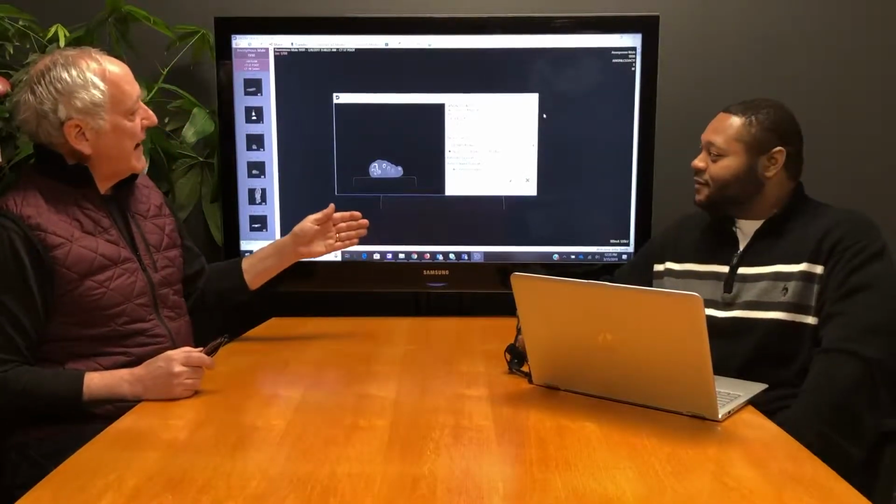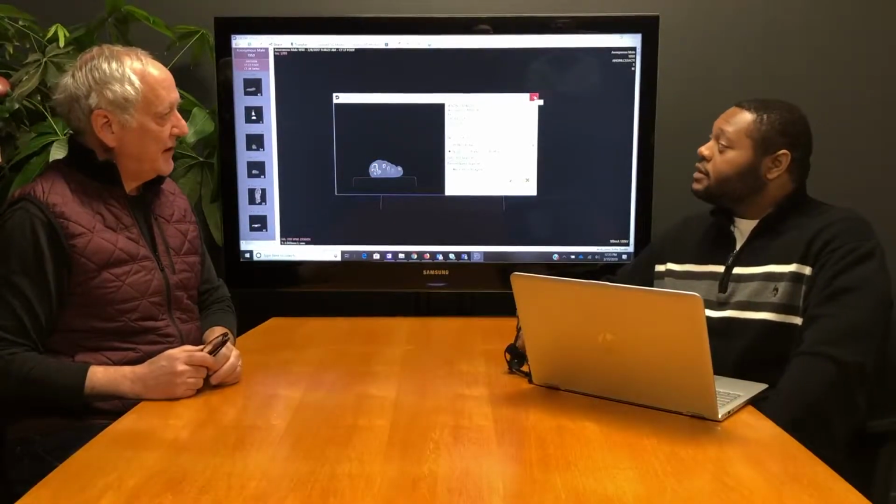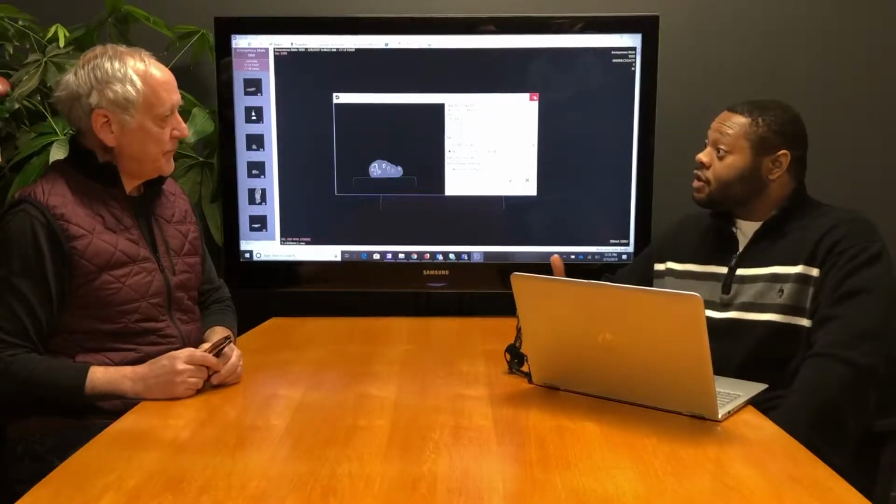And now, how does the receiver get this? They'll receive an email saying that something has come in for them, or it will just show up onto their PAC server? So they'll get an email. They'll also have it show up on their PAC server.